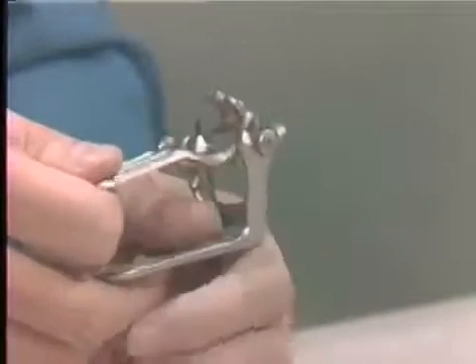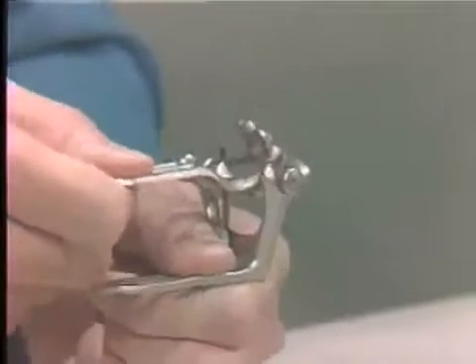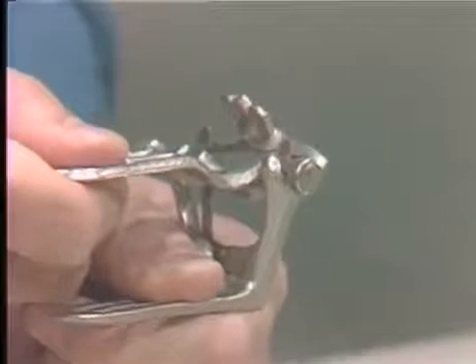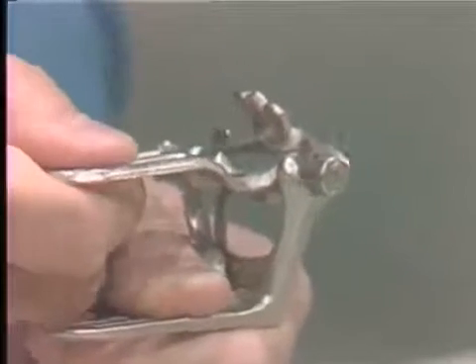And we have just a very slight protrusive movement that can be done, and you do this, of course, by moving the upper member of this articulator in a posterior direction. Now I have a case mounted that we'd like to show where we use a full arch on this same type of articulator.